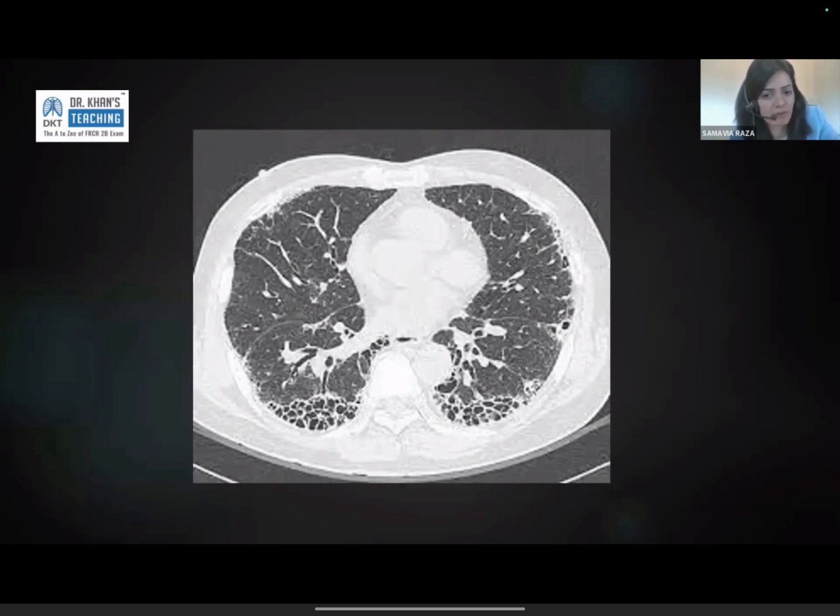Emphysema should not have a wall. Emphysema is not a lesion. Emphysema is just empty space where lung used to exist. So to differentiate emphysema, you want to look for that central dot sign. You want to see a strand of tissue going through that cystic area, a dot hanging in the middle of it. That is a vessel that used to feed that part of the lung. You want to see a strand of septa that will likely be containing that vessel. So that's how you differentiate emphysema from cyst. Emphysemas do not have walls and they usually have something hanging in the middle.